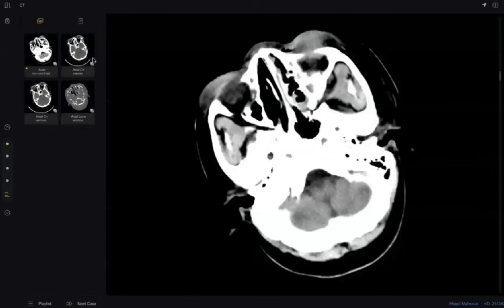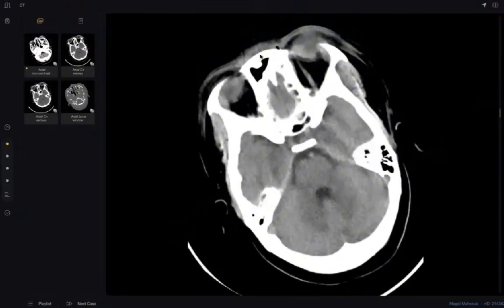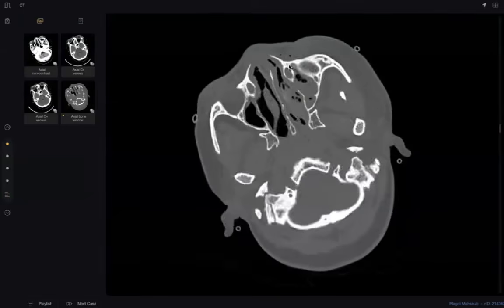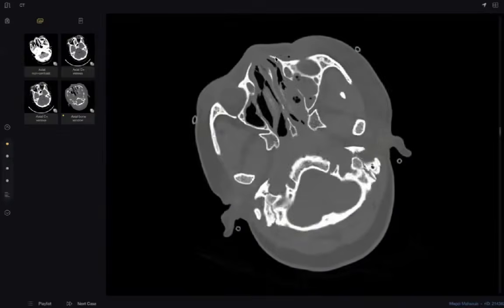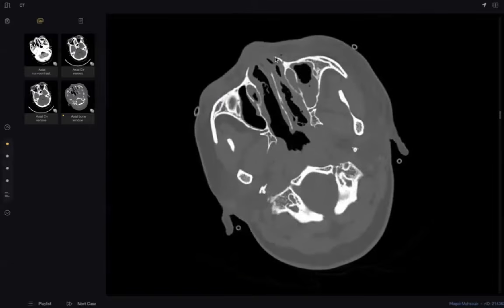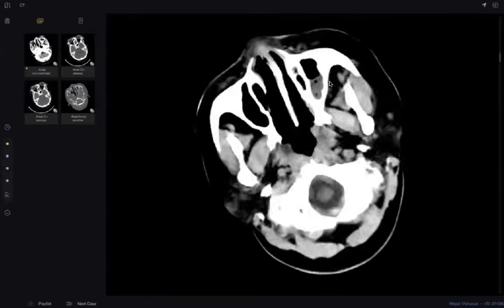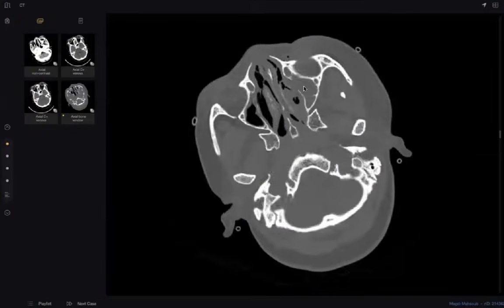There are very few subtle findings here. If you see here, in the preseptal region, there is eyelid thickening, and beside it there is some soft tissue, which I think is more obvious in the bone window, and a few foci of air. She did very well when she asked for the bone window, because in the soft tissue window you can't detect well what happened in the sinus.